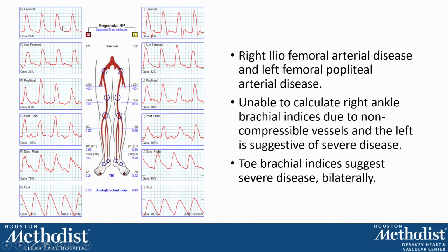Again, another patient, similar. We look at the left common femoral artery waveforms, they're triphasic. The right side, they're not triphasic. We know for sure that there is inflow disease on that right side. It starts with iliac disease. And as we go down, we notice how the waveforms start to change. If the waveforms remain normal throughout or very similar to the more proximal femoral, we would say it's only iliac disease.